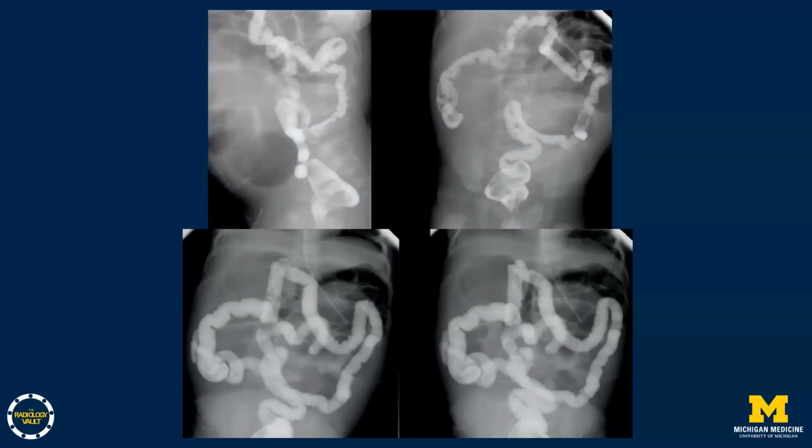We eventually reflux the small bowel, and we can follow those loops of small bowel from the right lower quadrant to the mid-abdomen. And then there is a rounded, sort of slightly bulbous appearance to the end of the small bowel where it abruptly stops. The contrast column stops. We see more dilated air-filled bowel above this. There is no meconium-packed terminal and distal ileum, and this is an example of ileoatresia.